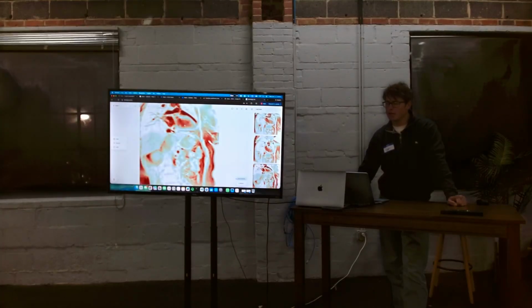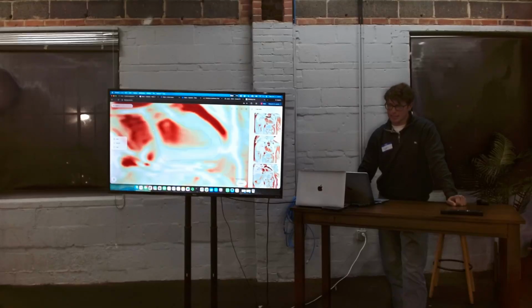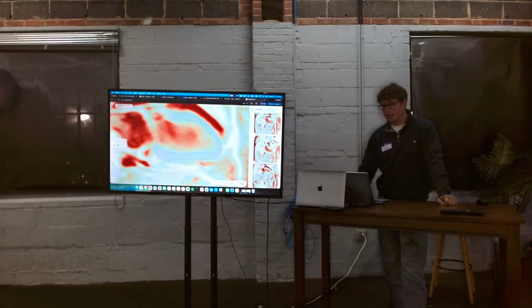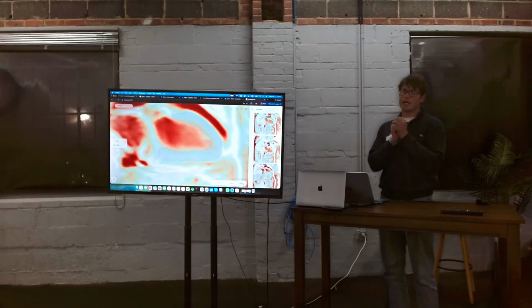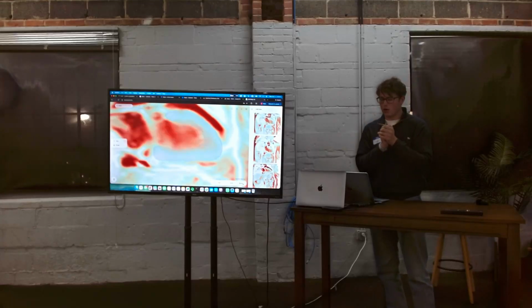But if you look at this on a 2D basis, you'll notice that it's drawing stuff right at the top of the heart, and that's probably not something that I would want the model to draw. So what you'll do is click on the object and try to erase that section, accept your changes, and run it. You'll see that it adjusts all the images throughout. The nice thing about this transformer-based architecture is that it's able to use context throughout and updates its history.